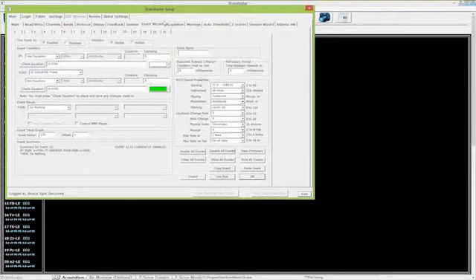But if you really wanted to, with the knowledge I'm giving you, you can have a second function of it. You can basically say, well, what if I wanted it to be when my upper is in the range, I want it to be driven half of the way, and when my lower, I want it to be driven another way. And you can basically have more control over it in that nature, with other factors going through it.